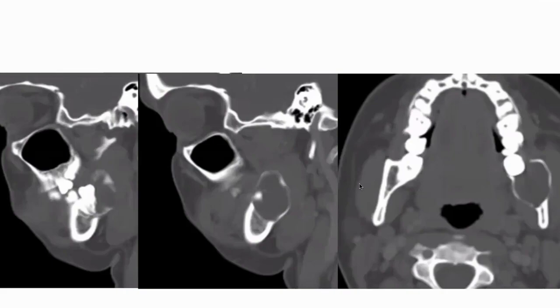These limited CT sagittal and axial images demonstrate a large expansile lesion with the root of the tooth. The lesion is surrounding the root of the tooth. Moreover, no internal calcification identified. No definite erosion appreciated. Mild adjacent expansion of the muscle appreciated. However, no fat stranding seen.